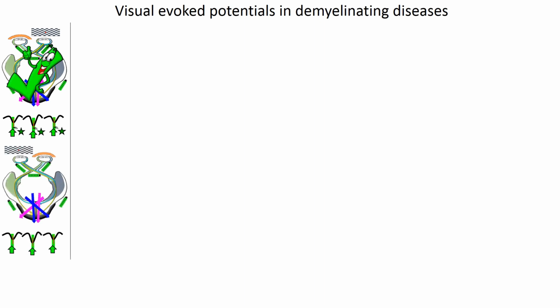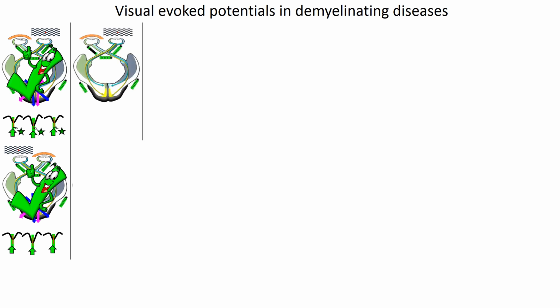A similar situation occurs after left eye stimulation. So the left eye testing is also normal. In the new figure I have just added, notice that the structure pointed by the arrow lacks green coverage. This represents left optic nerve demyelination.